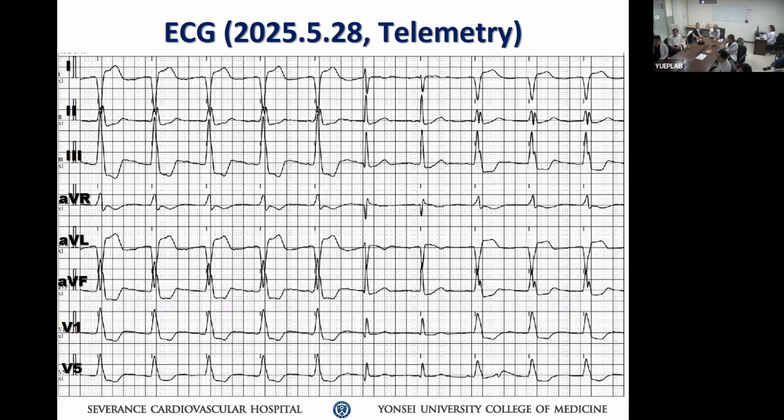This is idiopathic accelerated idioventricular rhythm. It usually happens with some external factors, like perfusion improving or other drugs, things like that. So you want to find the answer. But certainly that small notching that we see, we also see in the pre-tracing here as well.